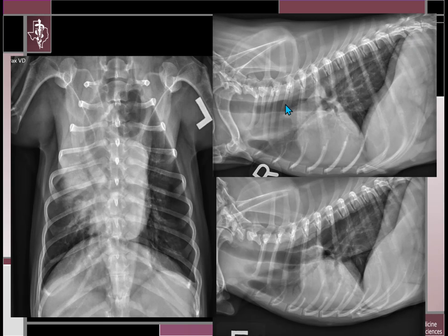If I look at this right lateral view, I can still see pulmonary vessels. They're kind of indistinct, but I still see little faint branches overlying the heart. Versus when I do the left lateral view, so remember, the left lateral view, we're going to be better at assessing this right lung. You can note that you can easily see these air bronchograms. So I see the airway coming down and bifurcating with nothing but fluid outside of it, and the airway bifurcating with fluid. And then there's a lobar sign. So there's this sharp demarcation between this alveolar pattern and then the normal air-filled lung.